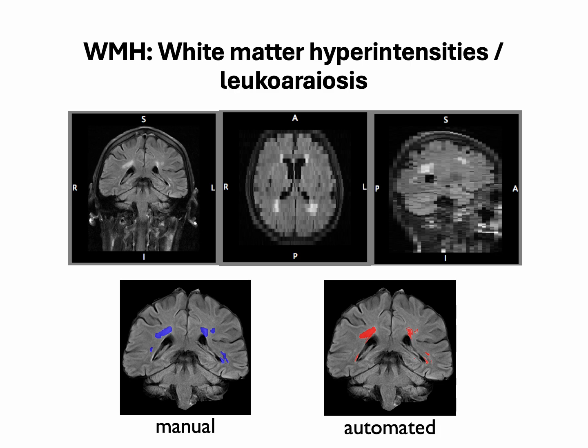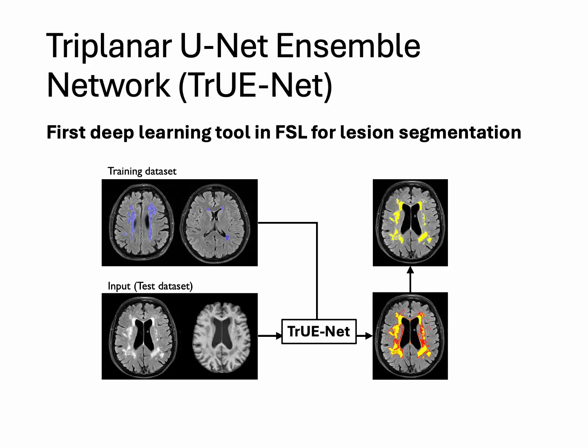Here is a sample of white matter hyperintensity, and we have also shown a manual segmentation of hyperintensities along with automated algorithm results.